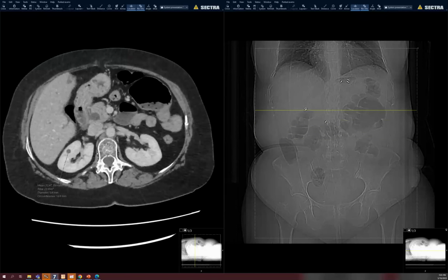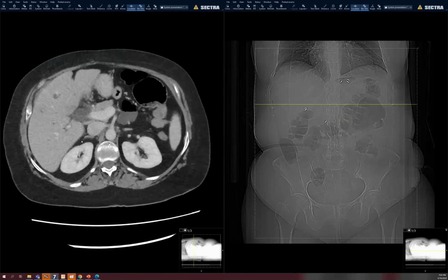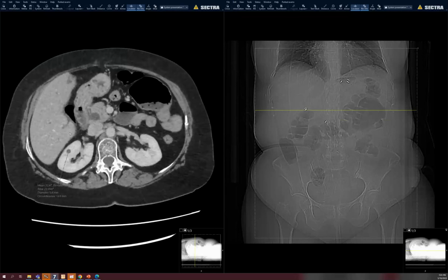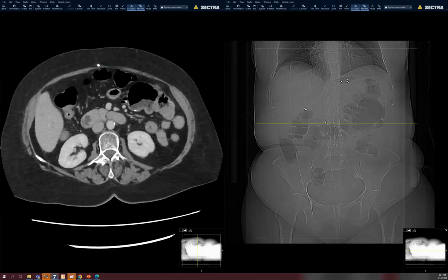Wow. Yeah, so the cholecystectomy was done in 1991, and after that now patient has presented with these symptoms, and the imaging showed this migrated clip which is causing obstruction.